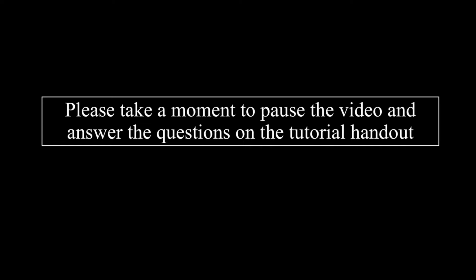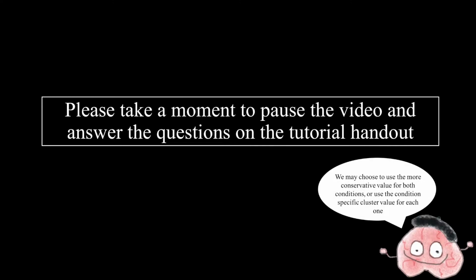You will find that the faces minus scrambled condition will have a cluster threshold value of around 47, and the faces minus body condition will have a cluster value of around 43. There are two approaches you could take. You could either use the more conservative, which is the greater of the two thresholds for both, or you could use separate thresholds for each of the two. Consider the two values and how similar or different you think they are when considering your response.